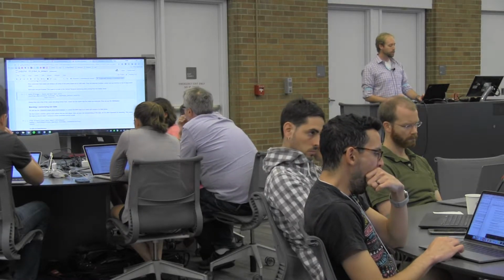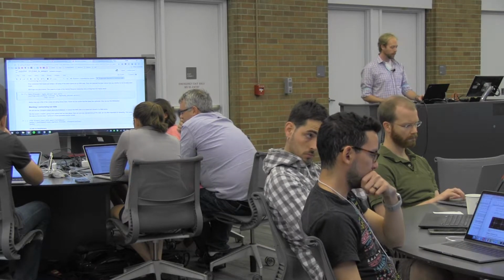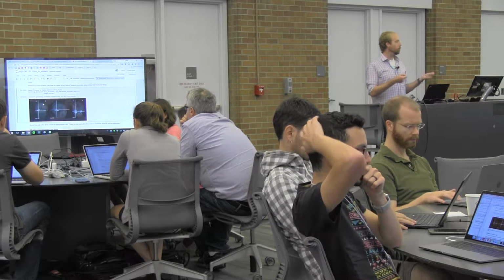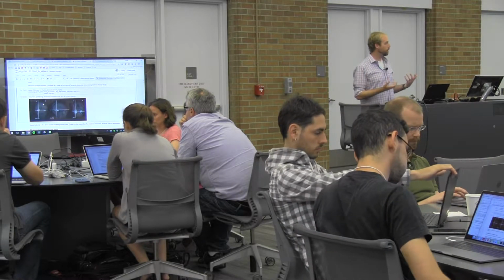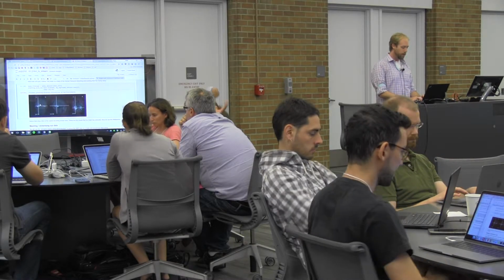And what I'm going to do is use the plot ROI function to visualize what that mask looks like. So again, this is just a binary matrix. It tells us which of the voxels we want to use, or actually, specifically it tells us which of the voxels the Haxby group used in generating the figures for their decoding experiment.